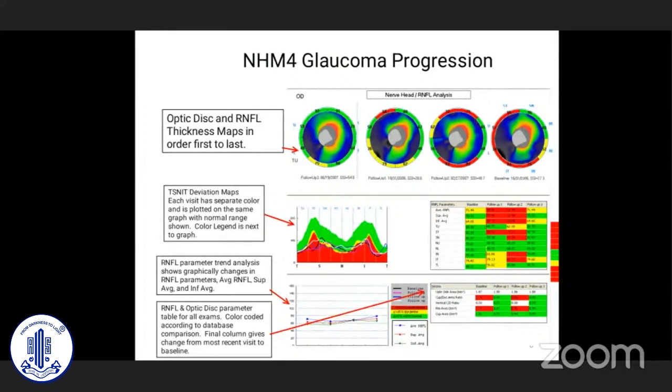But if you do, like in this patient, when we've done this test over a period of time, you can see there is progression that is shown by the appearance of the red colors on the statistical map. And this warrants treatment in this patient, when it was done by me every 6 months and showed progression, in my opinion. And that is what we did.